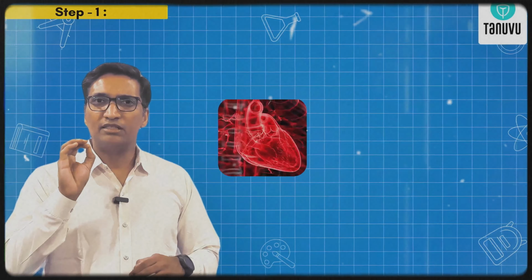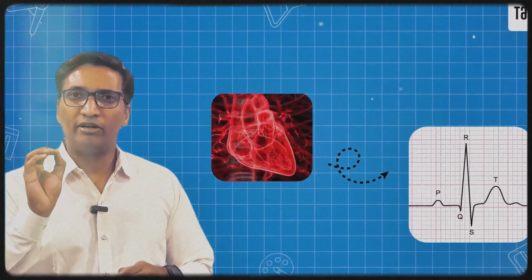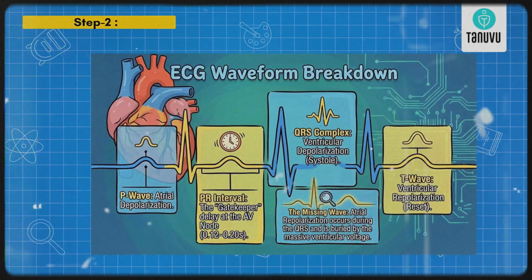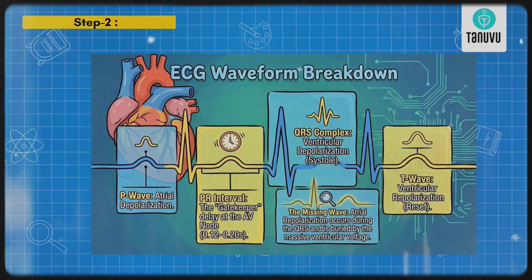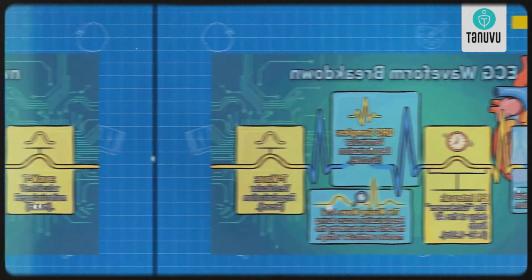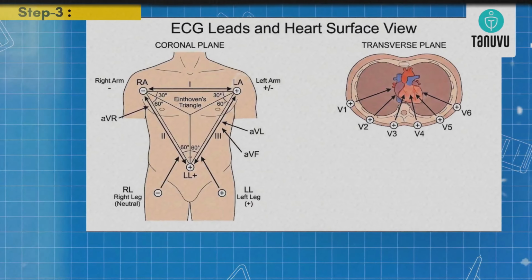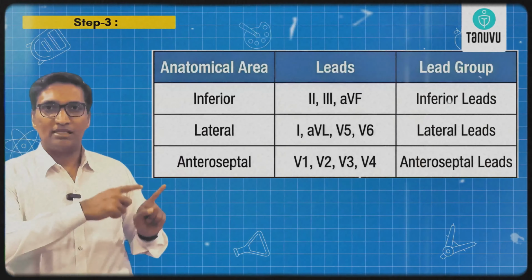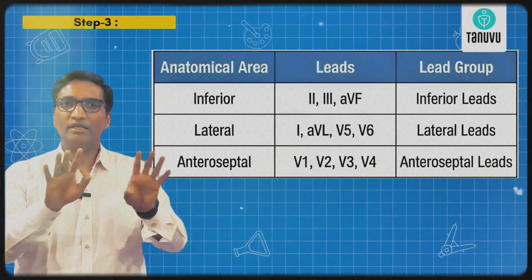How the graph turns heart's electrical activity into readable lines. Assess whether the cardiac rhythm is in synchrony and whether there are any cardiac arrhythmias happening. 12 leads: V1 to V6, lead 1, lead 2, lead 3, AVR, AVL and AVF. This table depicts what each lead represents. Understanding the electrical axis is helpful in understanding certain types of problems like bundle branch blocks or hypertrophies.